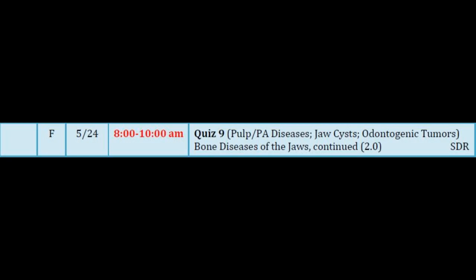Acute apical periodontitis will not have swelling and will have at most a slight widening of the PDL. This has a larger identifiable apical lucency and swelling, so that means it has to be a dental abscess. It's too big of a radiographic lesion, and swelling is present. So we have multiple pieces of information that we have to account for in our diagnosis.